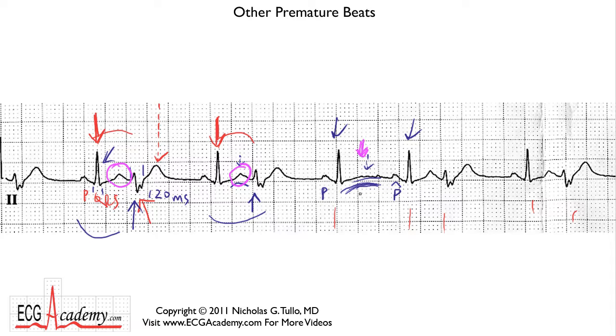Okay? You have to compare from one T to the next. So now if you look at this T wave and you look at this T wave, you can see that this one's much more bumpy. There's a big giant lump on top of that. It looks like Mount Everest to me, and that's the P that results in this wide beat. And so what are these beats? These are known as aberrantly conducted APCs.